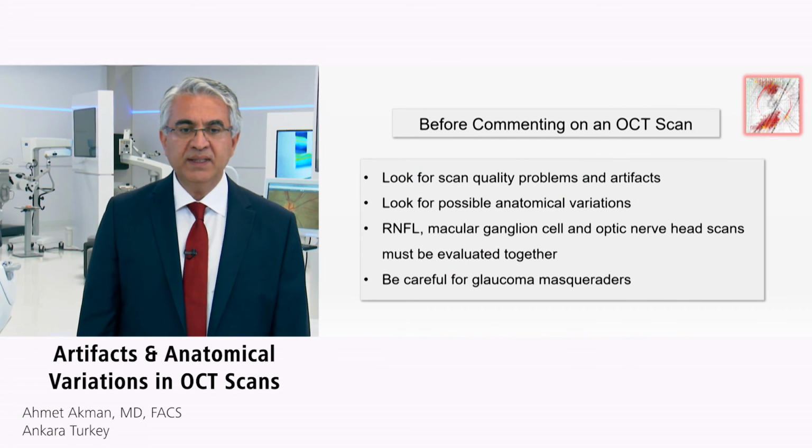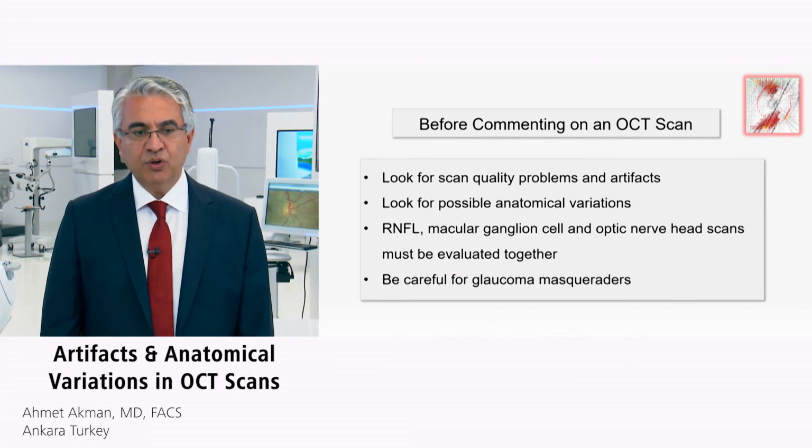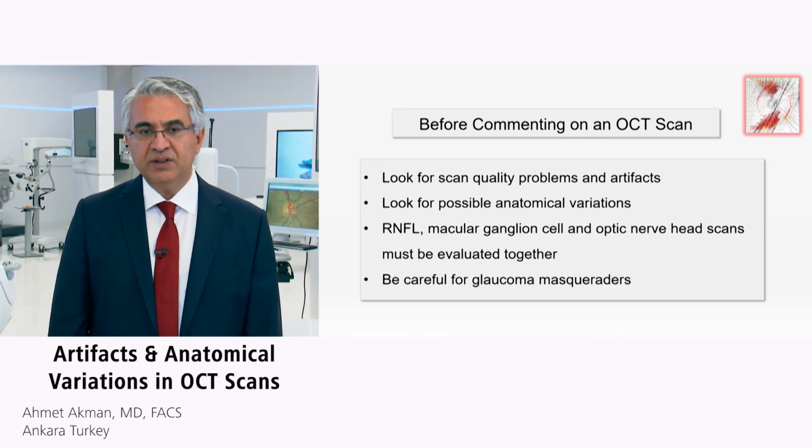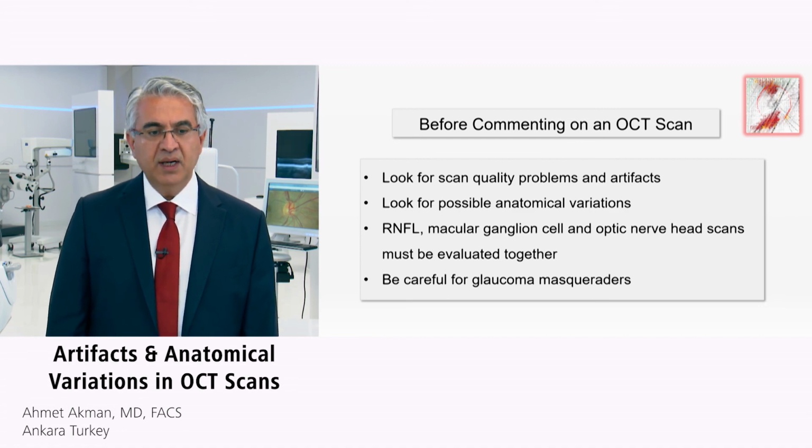So before commenting on an OCT scan, look for scan quality problems and artifacts. Look for possible anatomical variations. RNFL, macular ganglion cell, and optic nerve head scans must be evaluated together, and be careful of the glaucoma masqueraders.